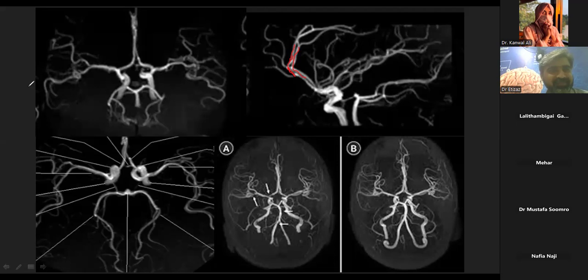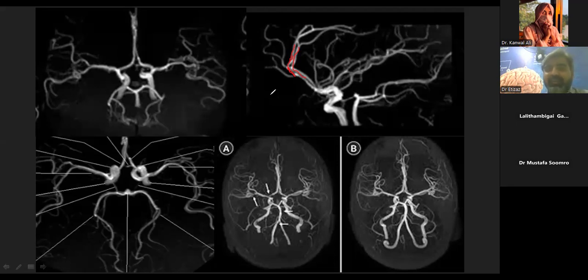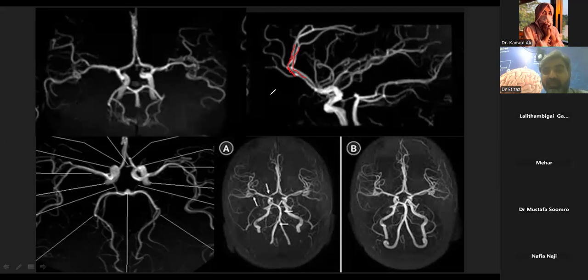Not sure, doctor. These are right and left both. Sometimes angiography confuses you, sometimes in exams and sometimes in angiography, they give a mirror image and double image, right and left, so the surgeon and the radiologist become confused. This is a mirror image, and you can see the right and left both are visible here. Okay, so look at here.